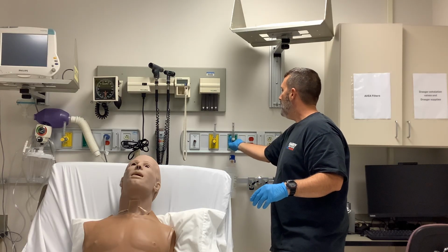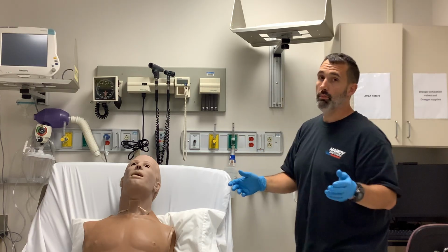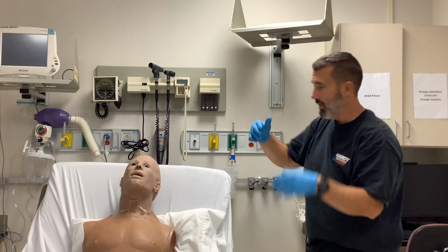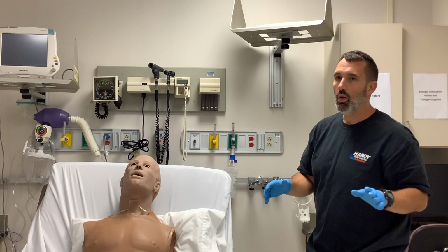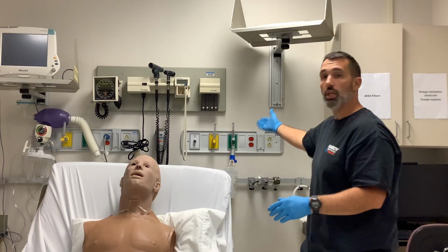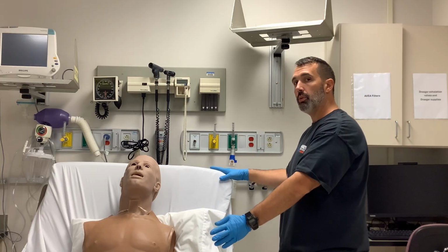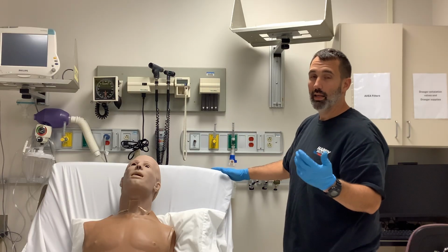And then obviously the air entrainment ratios will differ. So for instance, the same thing. Somebody might say, well, they need 100%. So if this thing is at 5 liters per minute, and I'm going to say, well, they need more oxygen, got to get more oxygen, let's take that to 100%. Now, I've even cut the total flow to the patient down even more. It's because now it's not entraining any air. It's just 5 liters of oxygen coming through that system. So 5 liters of 100% getting to the patient, but as they breathe in the room air, that's going to be significantly less. I hope you find this helpful.